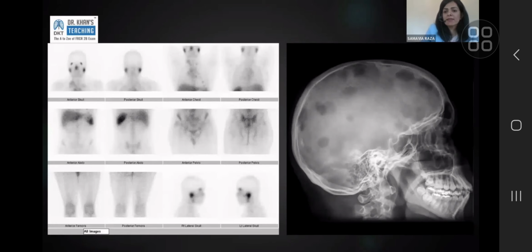If you had that skull X-ray in front of you, I don't think any of us would go with sarcoidosis being our first diagnosis. Most of us, and rightfully so, would think of diffuse or lytic metastases of the skull. So it can present in very alarming ways, with very progressive, destructive skeletal changes, but it can be multi-organ.